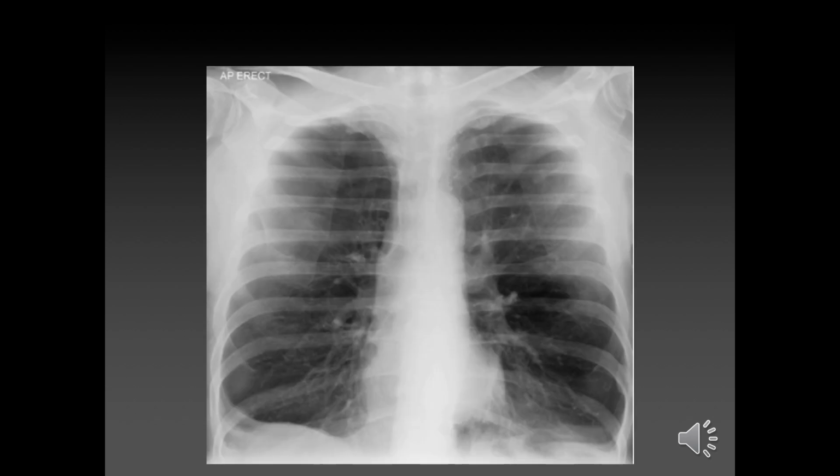Okay, so this one is emphysema. Again, you can see it's quite hyperexpanded. And there's something else you can see on this one as well. Does everyone think the airway is normal? Anyone think the airway isn't normal? So the airway is fine. I'm not trying to trick you, Toby. Now looking at the lungs, everyone agree that the hilar are normal? Yeah? Okay.